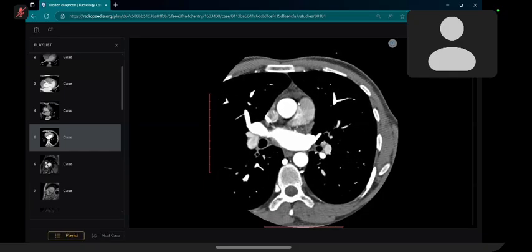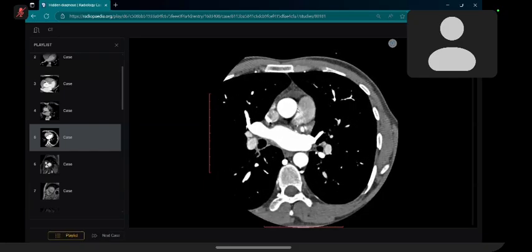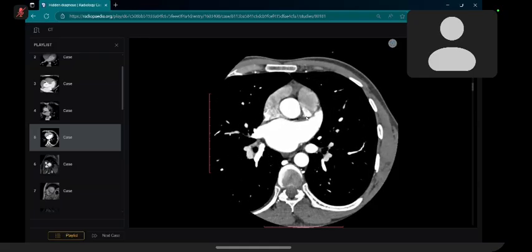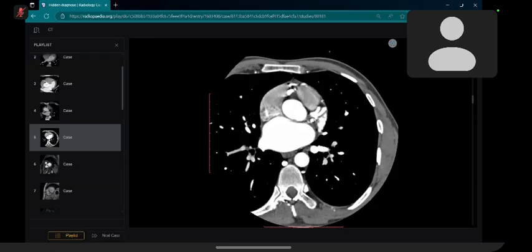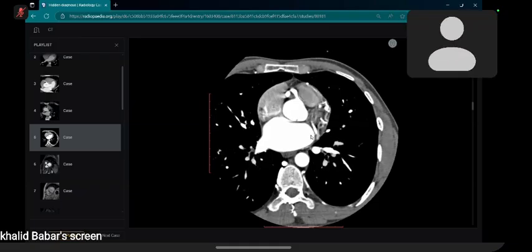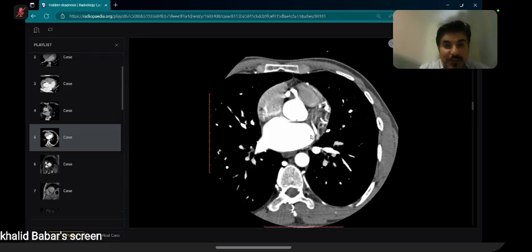It is going into the left appendage, and from here I can trace a few anomalous branches. Candidate one, the examiners of the FRCR exam are there to help you. When they want to guide you, let them guide you.